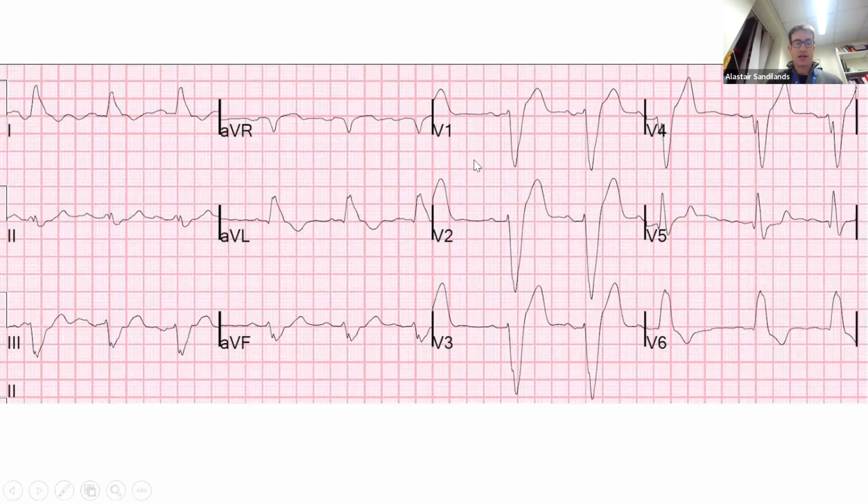So I'll go through these ECGs for you. This is an ECG. It's sinus rhythm, not a tachycardia, obviously, but I'm getting you to look at V1. We've got a P wave and a broad QRS. This is broad, so we think about bundle branch block. It's negative in V1, towards the left axis, and it doesn't become positive till V5 or V6. This is in a normal rhythm, in the resting state. This is left bundle branch block.